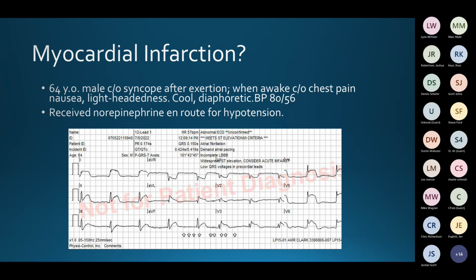But you see now, here you have an upright complex, and you have a large ST segment elevation, same as this one. So this is concordance.